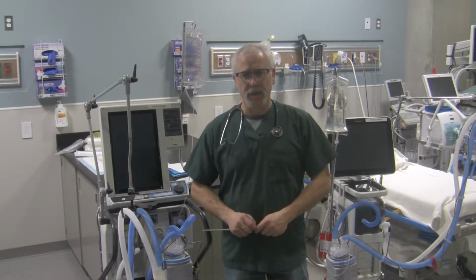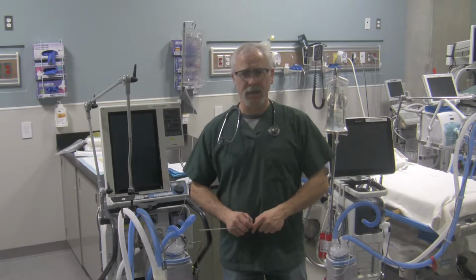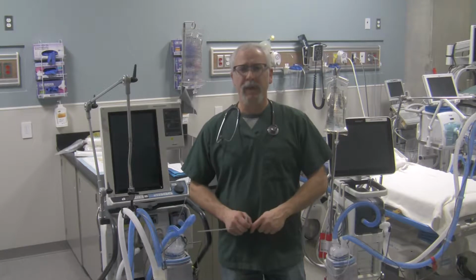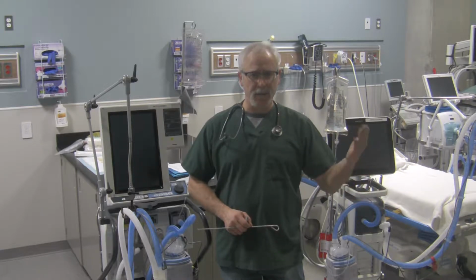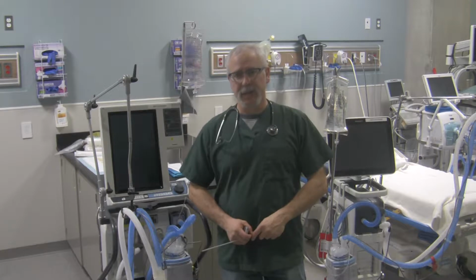Well, most of the ventilators, it doesn't matter which brand it is, and this video is not a promotion for any ventilator manufacturer or company or any specific model of ventilator. It's just simply a video to show you the main components of a ventilator, but they're typically going to be the same on the different ventilators produced by the different companies. There might be some slight differences, but generally the main components are the same in how they function and how they get the gas to the patient, and then from the patient, does it go back to the ventilator or does it just simply vent into the atmosphere?